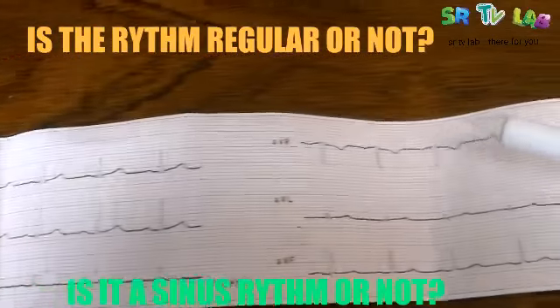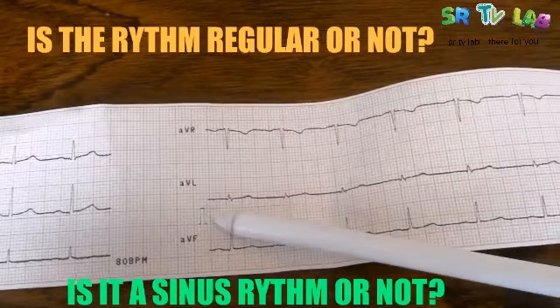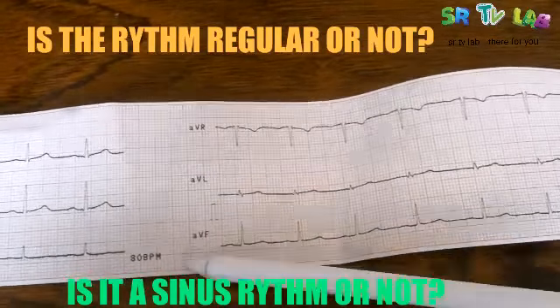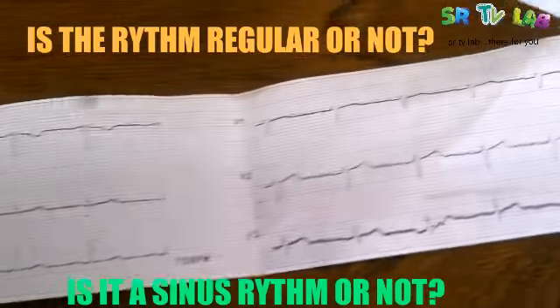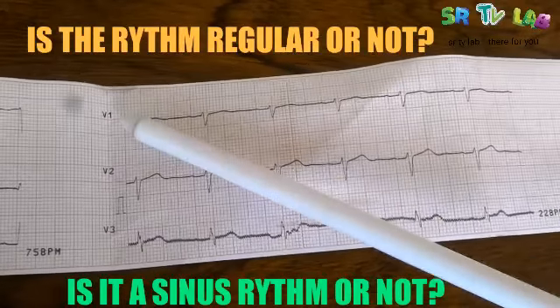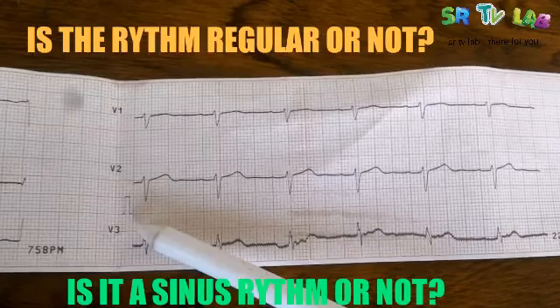Then we go to aVR, aVL, and aVF. Augmented voltage right arm, augmented voltage left arm, augmented voltage foot. So these are their heart tracings. Then we go to what we call precordial leads or chest leads. This is V1 or chest lead 1, V2 chest lead 2, V3 chest lead 3.